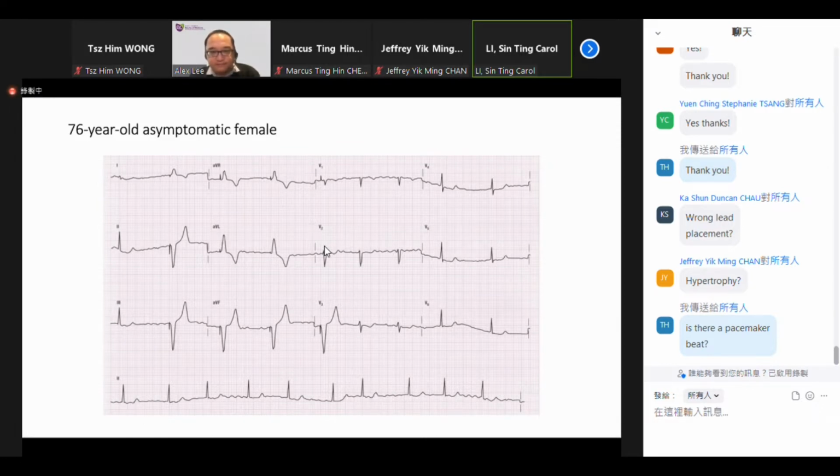I think not, because... Why? Because the patient still has irregular heartbeat. What's the function of a pacemaker? To regulate the heartbeat. So this patient is asymptomatic. Do you think that the pacemaker function is not regulating the heartbeat in this patient? Okay, then probably the pacemaker is working fine.